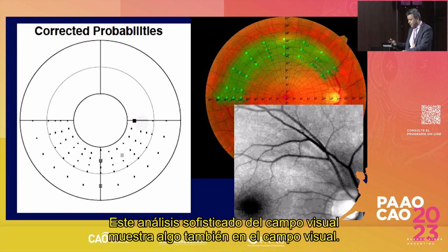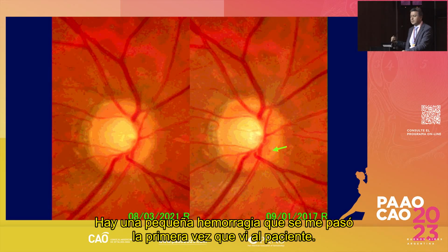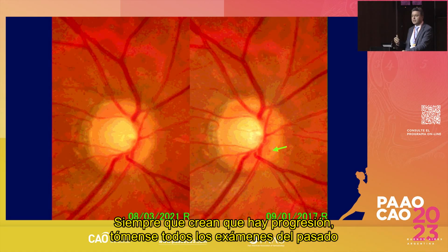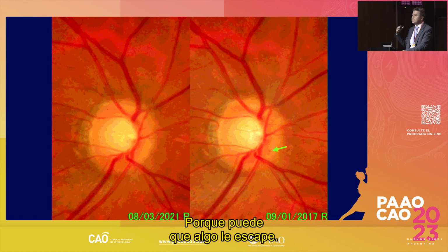I have some fancy analysis of the visual field that I'll skip, showing that something also happened with the visual field. And looking back, that's a good thing about having the retinography: in 2017 there's a small hemorrhage that I missed the first time that I saw the patient. So every time you think there's a progression happening, take all the past exams that you have to make your mea culpa. Do you know mea culpa? It's Latin, everybody knows that. So maybe you're missing something.